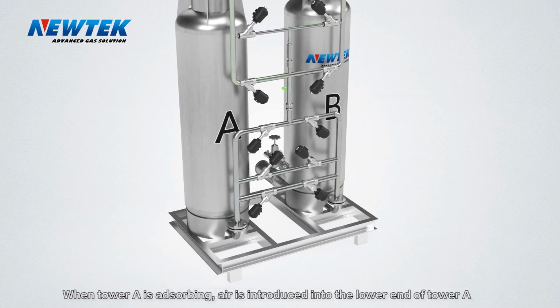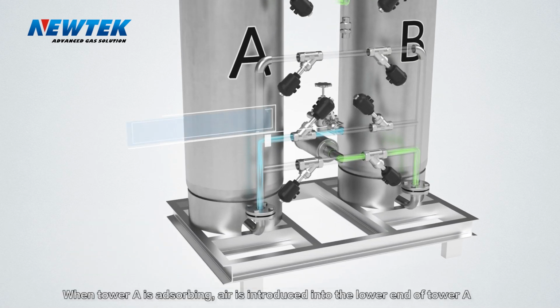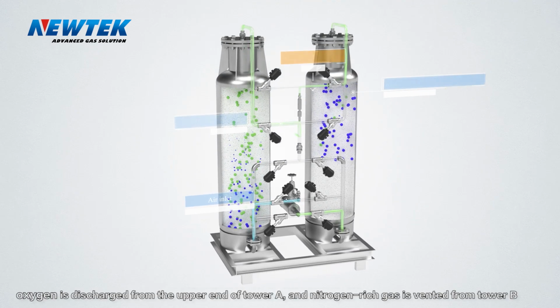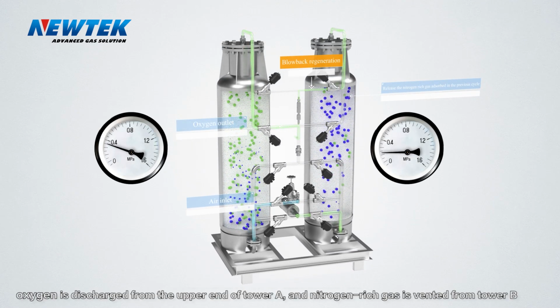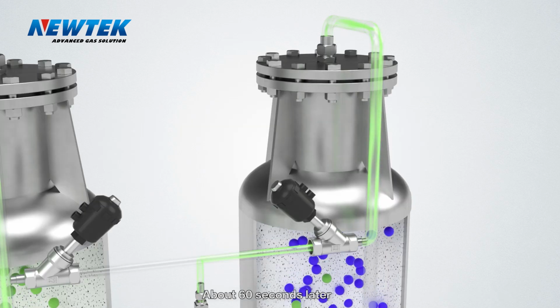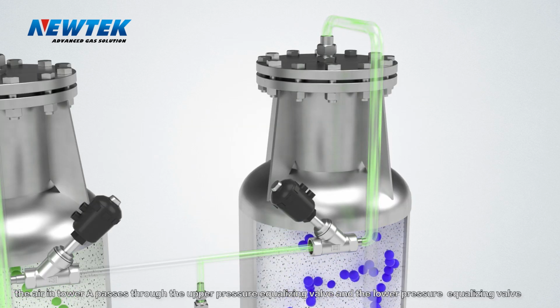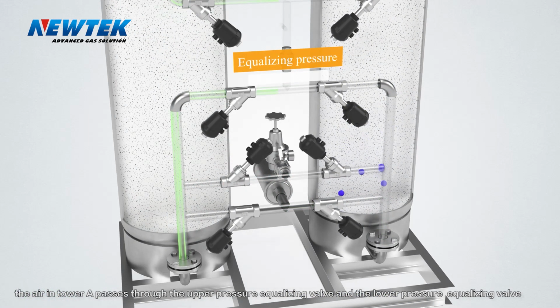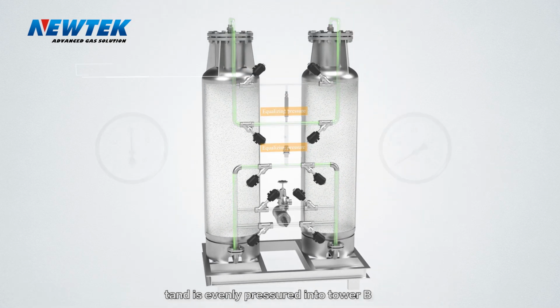When tower A is adsorbing, air enters the lower end of tower A. Oxygen is discharged from the upper end of tower A, and nitrogen-rich gas is vented from tower B. About 60 seconds later, the air in tower A passes through the upper pressure equalizing valve and the lower pressure equalizing valve, and is evenly pressured into tower B.